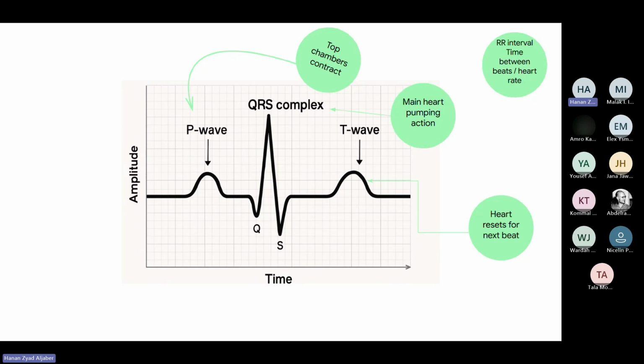In these, the beat is wider and irregular, the peak is less sharp, and the shape is a bit disoriented. We can see that difference really clearly with our eyes. So what we're adding today is an AI reasoning layer on top of what we can tell. Instead of just hard-coded rules, we will extract numbers from the signals using signal processing, and then hand those numbers to Gemini and ask it to reason about them.